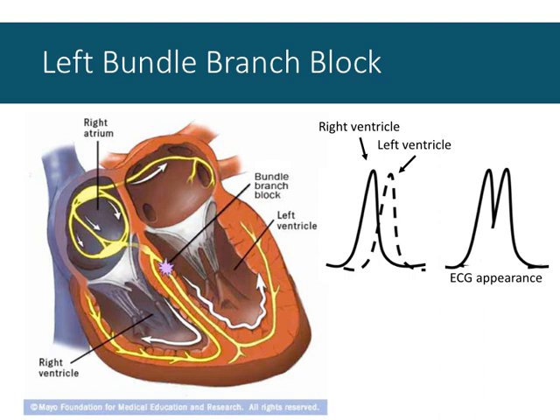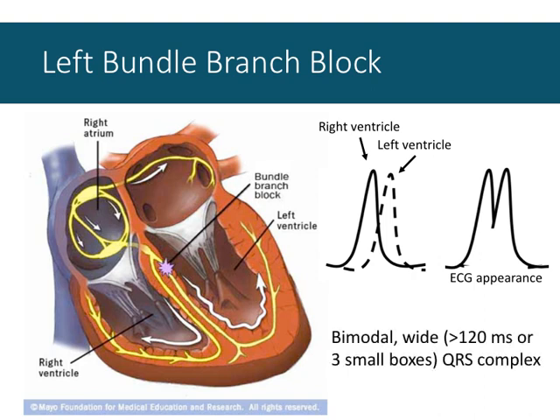And so we'll often see, if we're looking from the left towards the right, this characteristic trace. We see the right ventricle first and the left ventricle second with this bimodal QRS complex. Or it's not a classic QRS complex, but you'll see what I mean. As we already acknowledged, the QRS complex is wider than normal.